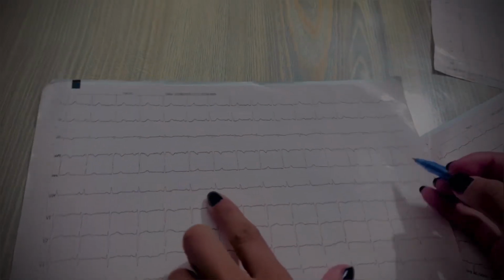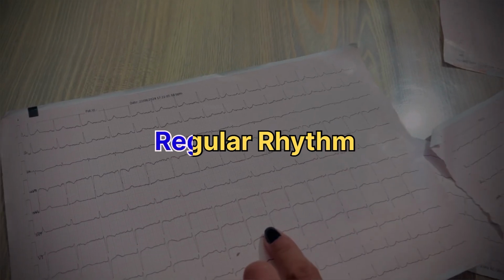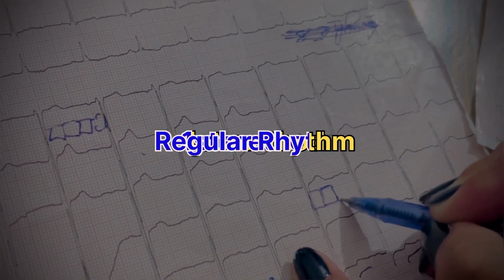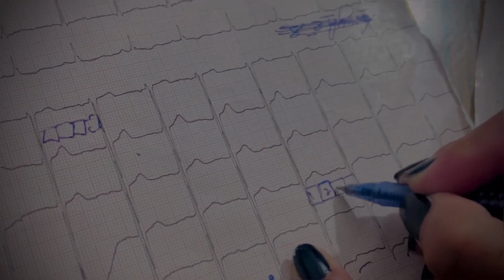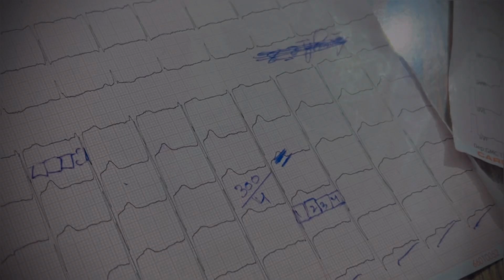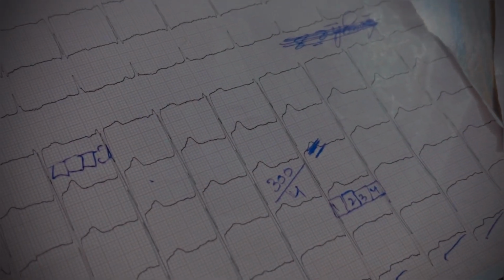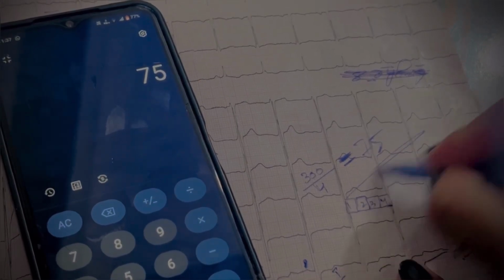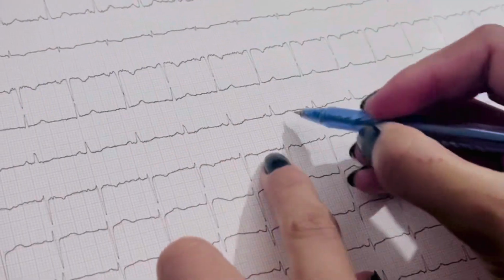Now let's learn how to calculate the rate from an ECG, starting with regular and then moving on to irregular rhythms. For regular rhythm, we can use the formula 300 divided by the number of large squares between two RR waves. Here there are 4 boxes and we divide 300 by 4, which is 75. So it has the rate of 75.